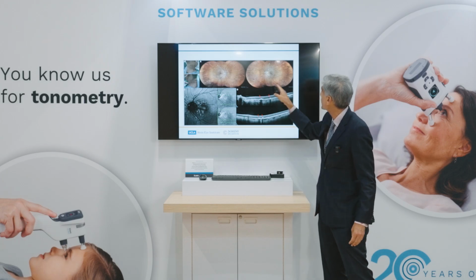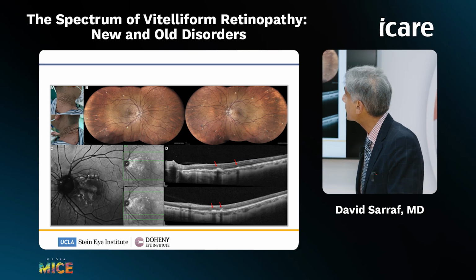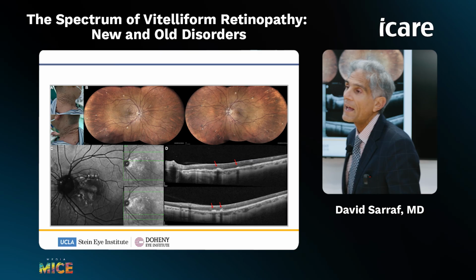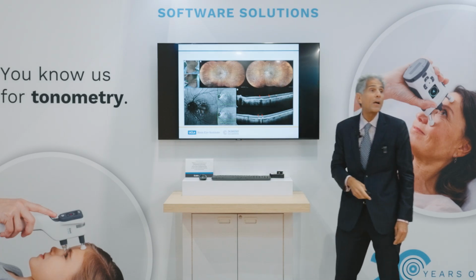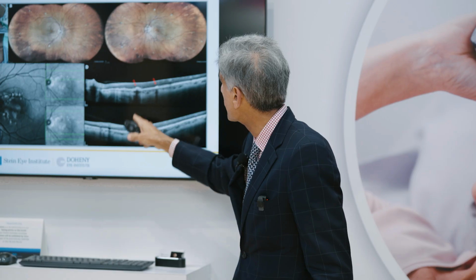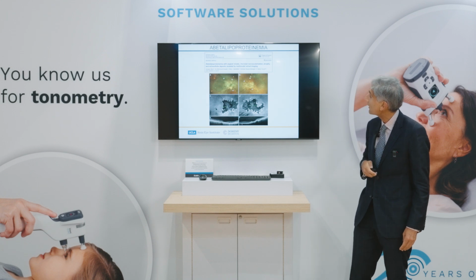And this patient also had comet lesions. You can see these white lesions with streaks. And that's a very characteristic feature of pseudoxanthoma elasticum. You can tell that the patient has pseudoxanthoma elasticum because he has the characteristic wrinkly skin in the intertriginous areas. And you can see the vitelliform lesions here that are lighting up on autofluorescence. So this was another patient who had angioid streaks, but in this case from PXE, that also had the vitelliform lesions. Again, showing the angioid streaks and the comet sign that you see with pseudoxanthoma elasticum.